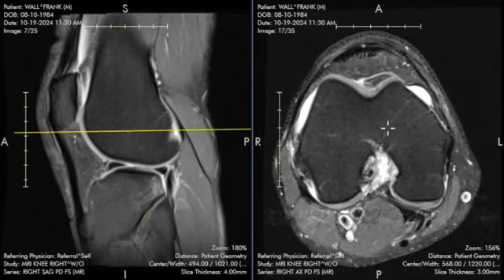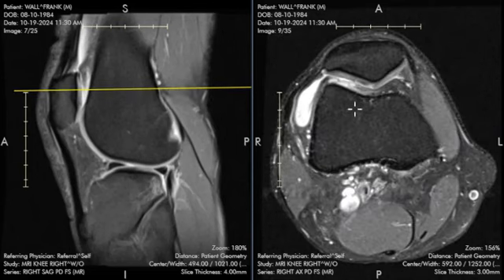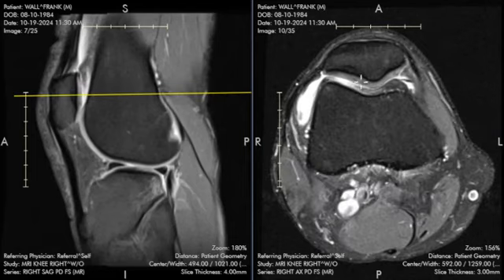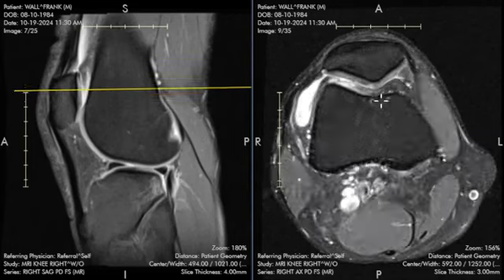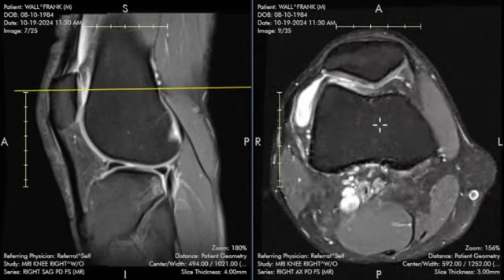Next, I noticed that there are several partial thickness fissures of the median patellar ridge cartilage and the lateral patellar facet cartilage. These do not exhibit any underlying bone edema, and thus they could be chronic. It's possible that these could be the results of recent injury, but cartilage takes a long time to heal. Sometimes it doesn't heal at all, and so fissures that don't have any bone edema may have been around for some time. It's possible they might not be related to this recent injury at all.